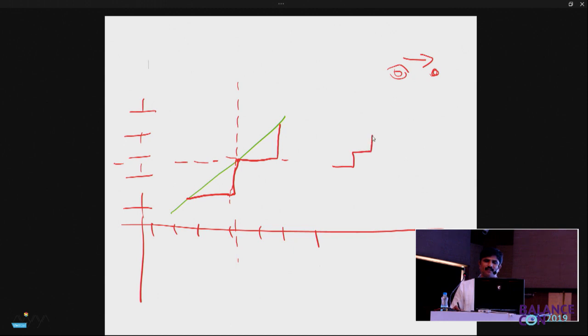So you see this right angle kind of movements. What kind of pursuit is this called? Saccadic pursuit. This is a saccadic pursuit where the eye is not capable of making a pursuit eye movement. It compensates for the inability to make pursuit eye movements by making saccadic jumps. Okay?